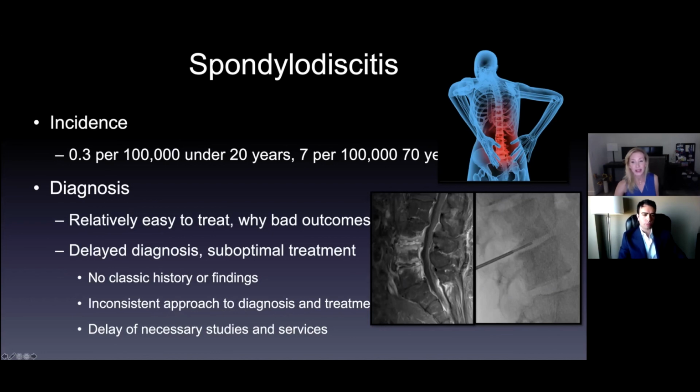When you take all the fat signal out, when you're in radiology, you'll learn all about the physics to do these magical things to make the images look different. You take out all the fat signal. Everything here is true enhancement, which in this case means it's infected. Well, in the bones. This is kind of complicated, too much radiology, but vessels are actually also bright. So there's a little bit more that's enhancing that's not infected, but most of this enhancement is infection. Is that a little bit more what you want to hear?